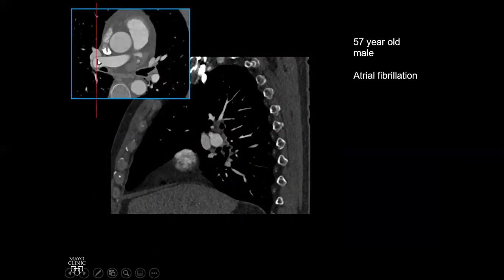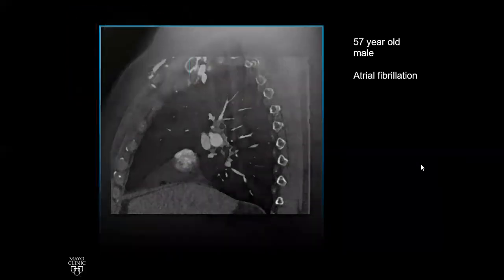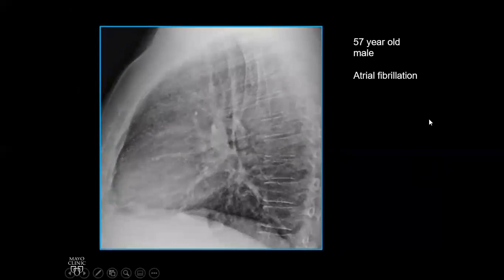level out here. This is pulmonary artery there, actually the interlobar pulmonary artery. In front of it, it's the pulmonary vein. This is the right upper pulmonary vein. Together, out laterally enough, they're surrounded enough by lung that they make a circle on the lateral radiograph, like this.